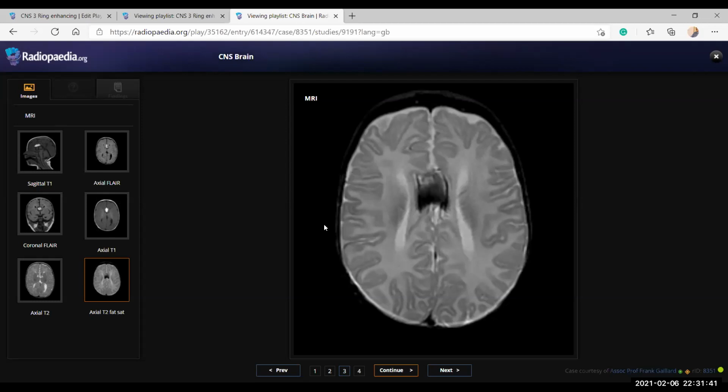So do you know what are the types of intracranial lipomas available? The two types. Hello. Can you hear me? Yeah, I can hear you. Curvilinear and tubulonodular, I think. Okay. What type is this? This is the tubulonodular type. Okay. So we'll go to the next.